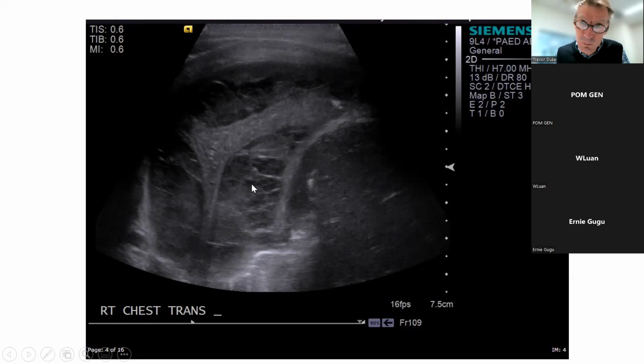But if it's a very complex effusion with lots of fibrin strands, and it's what we call organized or chronic or complex empyema, then sometimes putting a needle in here or a drain in here won't drain these other pockets of fluid, because it's simply walled off from where you put the drain in. So I think it's good to get some experience with doing ultrasounds of the chest to see what you can see, identifying the lung, identifying the fluid if it's there, identifying whether it's simple or complex, and identifying the normal structures like the liver and the diaphragm.